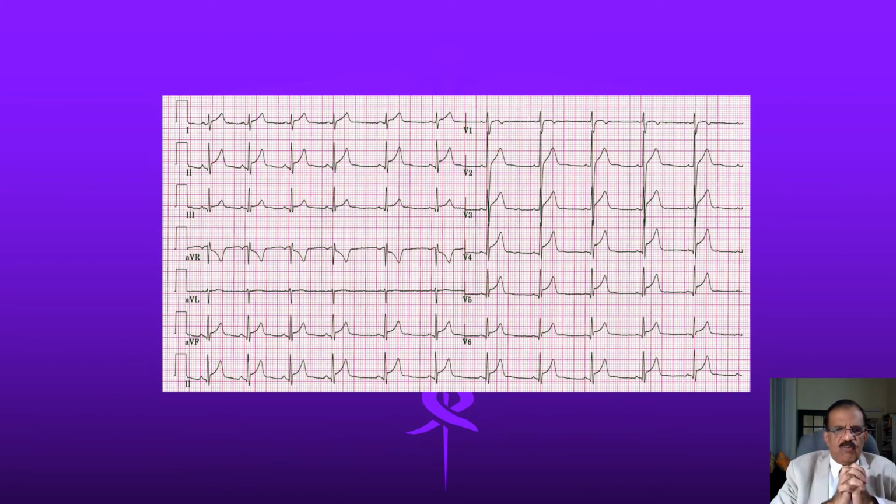What about this? Whenever we discuss myocardial infarction, we often talk about ST segment elevation, and this is another condition which can present with ST segment elevation, and it may also cause chest pain. What condition can you imagine? A condition which can cause cardiac pain but not ischemic in nature, and it may also result in ST segment elevation.